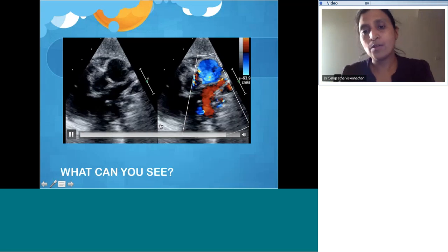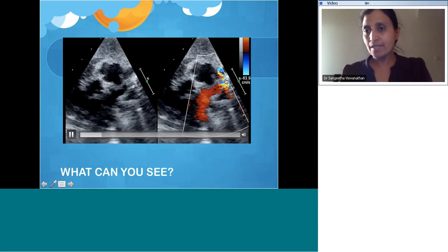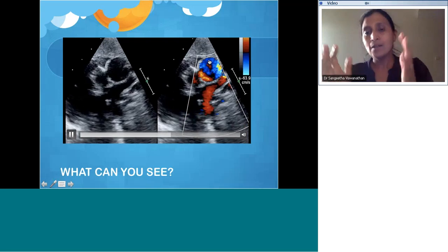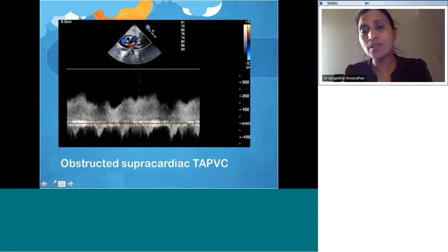Okay. So this vice, V-I-C-E, is the bronchopulmonary vice. I think that's the name. But it's basically between the left bronchus and the left pulmonary artery. There is a narrowing of the vertical vein, and that gives rise to obstruction. And here you can see that there is a gradient. Normally, what are the characteristics of unobstructed venous flow? What is quite abnormal here, irrespective of the gradient? Normally with pulmonary venous or systemic venous flow, what do you expect with the Doppler tracing?